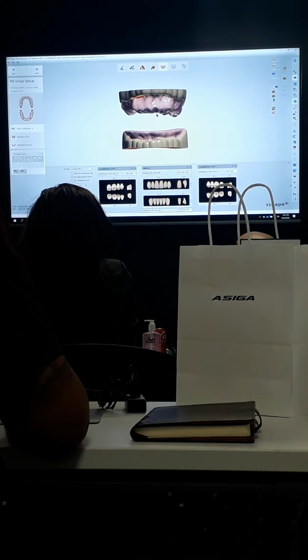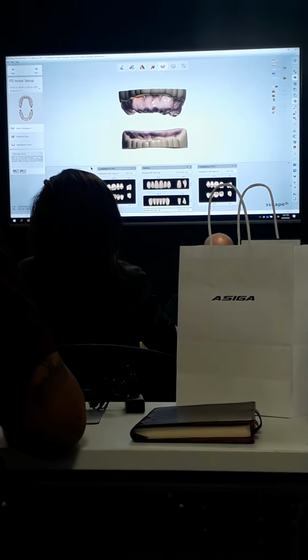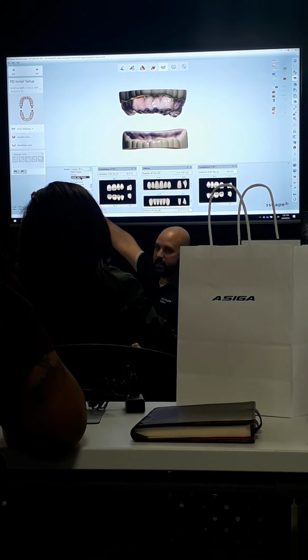So now we're at the point where we work a little different here. Rather than having to put wax on a model and then set teeth in it, we literally are just working with the teeth. So the first thing you're going to want to do, we're going to use the Dentsply libraries. I'm going to go here to the provider box and drop it down. There's a few libraries that you're going to want to look for. These 4 here, everyone should have these downloaded.